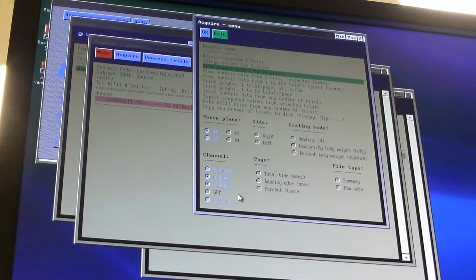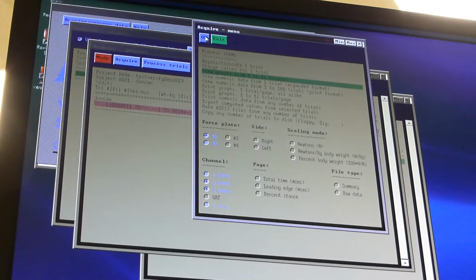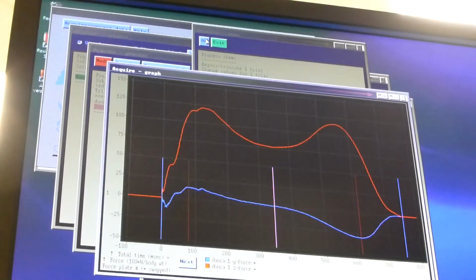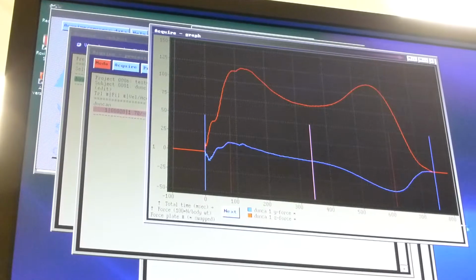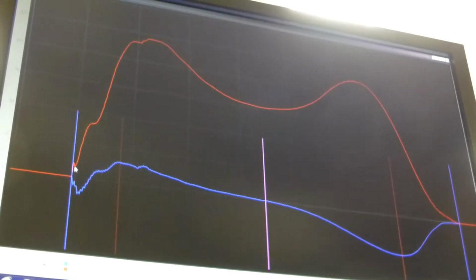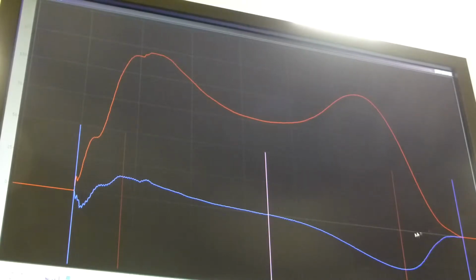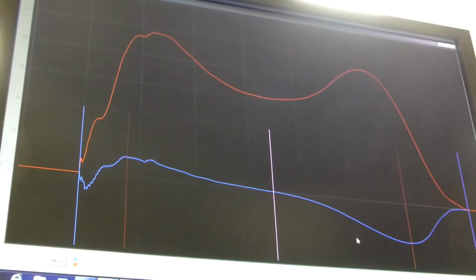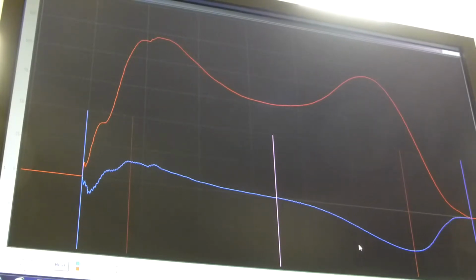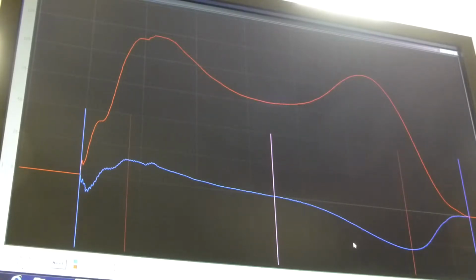The first graph page you see, tell me if I'm right. It should show only the red curve and the blue curve and a series of vertical colored lines. Correct. On the case of the dog, you'll see two of these on one graph instead of just one. This is the forefoot and hind foot. So for the human, you should see a total of 5 colored lines, and for the dog, 10. If you see all 10 lines, that's all you need to know at this point, because that tells you the acquirer is able to compute everything it needs for that channel. So it's something you can do pretty quickly. Just stop, look at this, and then go on.